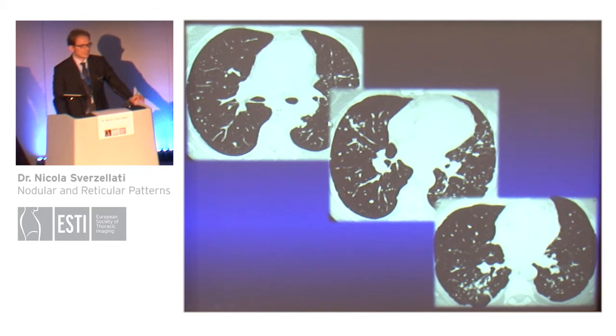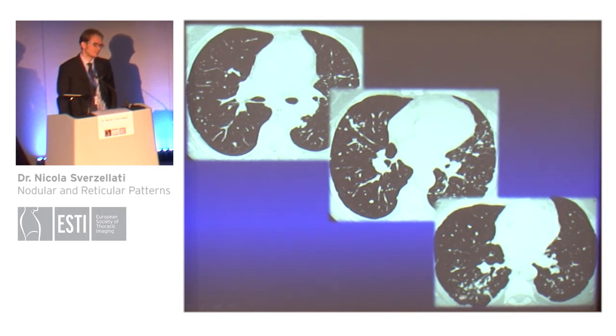This is an example of a patient with silicosis. In silicosis, nodules show a perilymphatic distribution, but as compared to sarcoidosis, are more randomly distributed. Generally, nodules are larger and tend to conglomerate in the pleural regions, forming pseudoplaques.